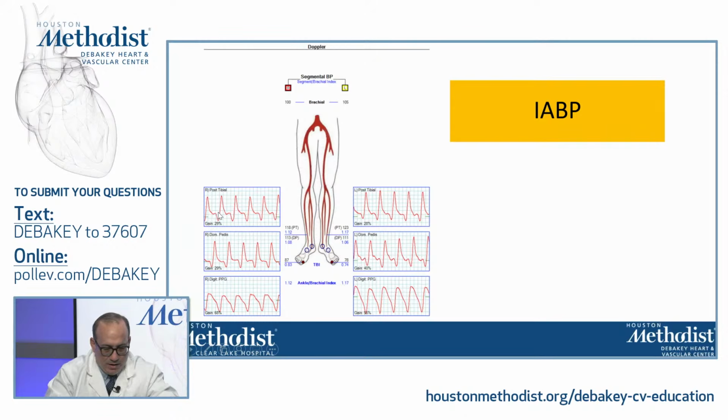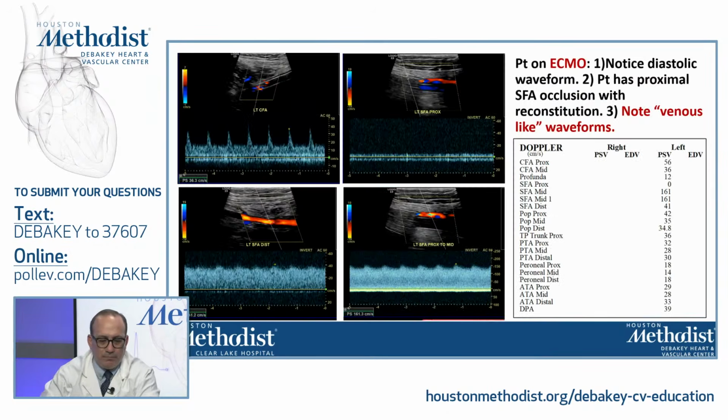And then this little peak here is when the balloon expands to get you that extra forward flow. And then lastly, this significant dip at the end of diastole, right before the next systolic, is when the balloon deflates and you get a big reversal of diastolic flow.